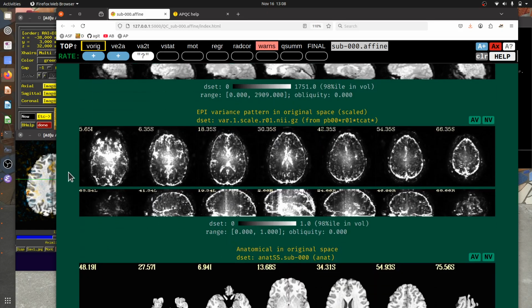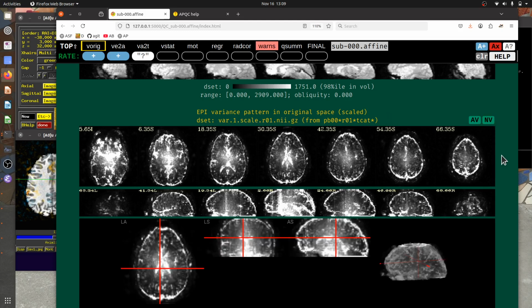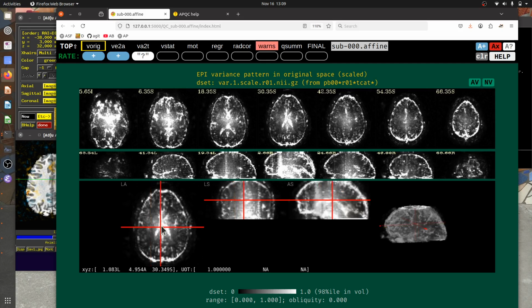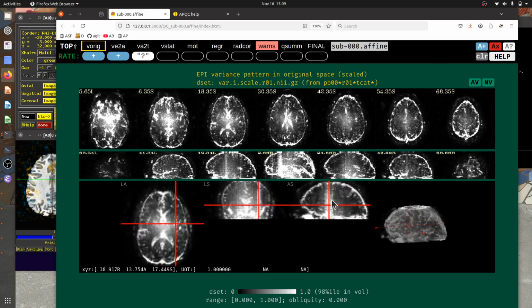Below it now, what we've inserted here is a map of this scaled variance. The variance line artifact problem is actually so widespread and such a deep problem that we have put this here to have a searchable, navigable map of just the variance. And now, as you see, as I move through here, you can recognize some of these very bright lines that appear here.